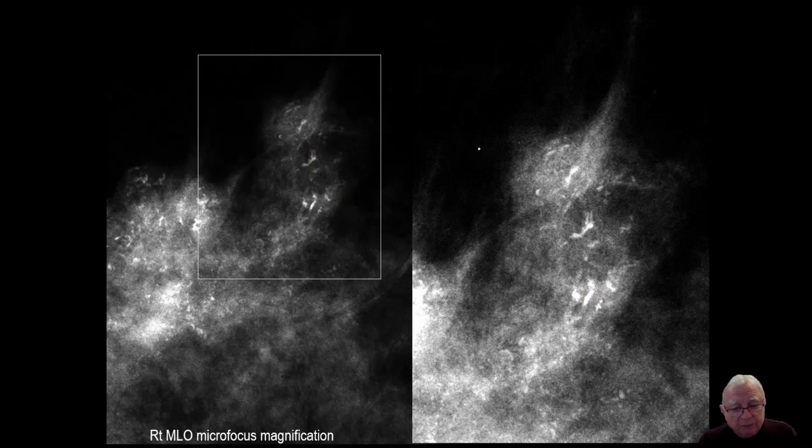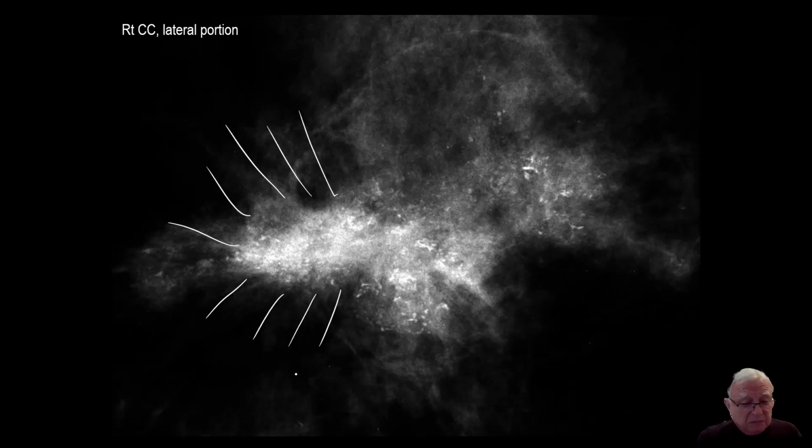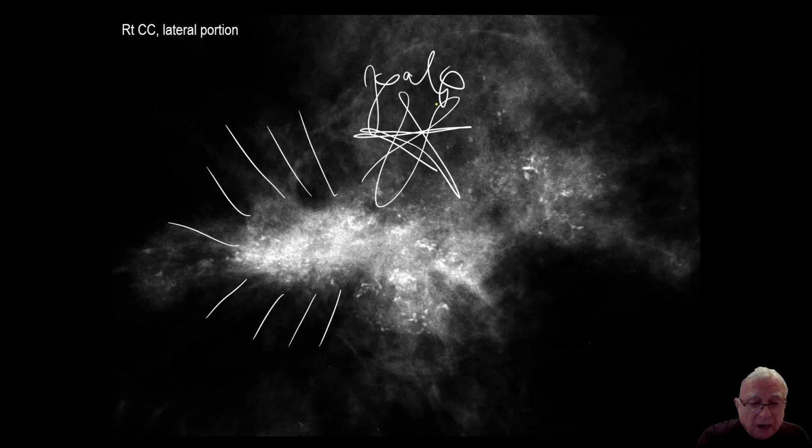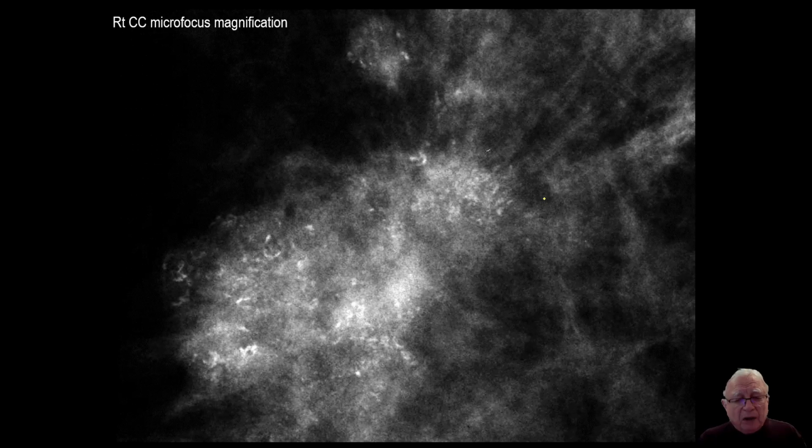But be careful. There is a basic rule in medicine. You never perform mutilating surgery without microscopic examination. Then you smile. I put my money on this being a carcinoma because even if I ignore the calcifications, this is a palpable architectural distortion. And I learned in school that there are two options. One of them is cancer and the other one is cancer. But keep your head cool and prove your working hypothesis.